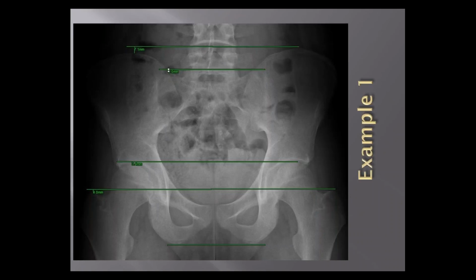Let's jump in. Here's an example of a pretty easy hemipelvis to calculate. This is a pretty traditional one; you'll see this person is showing about a 3 millimeter leg length inequality. The ischial tuberosities, these two little points that you sit on down here at the bottom, are measuring perfectly even with no height difference between the two.